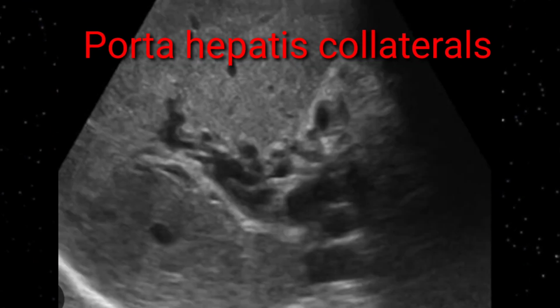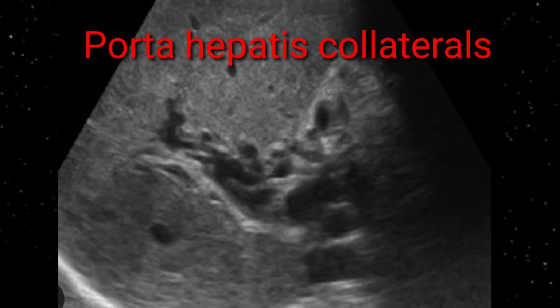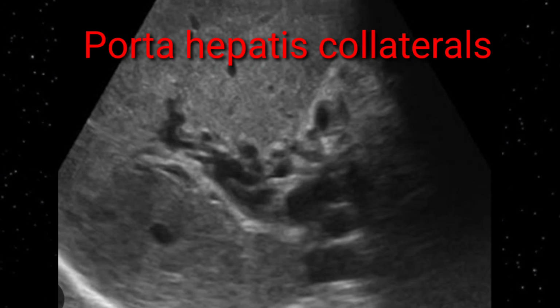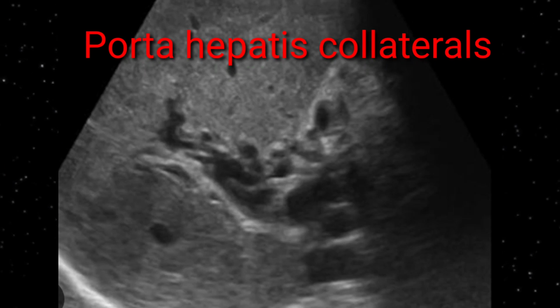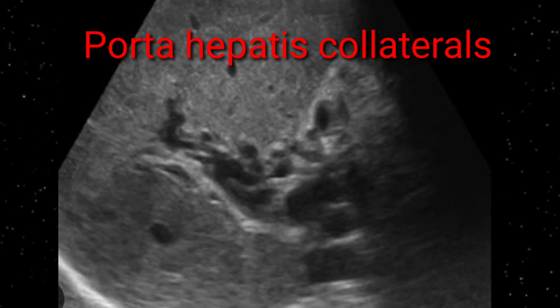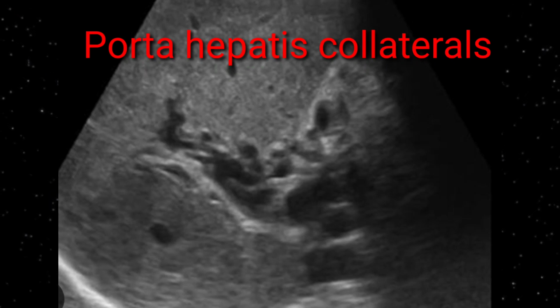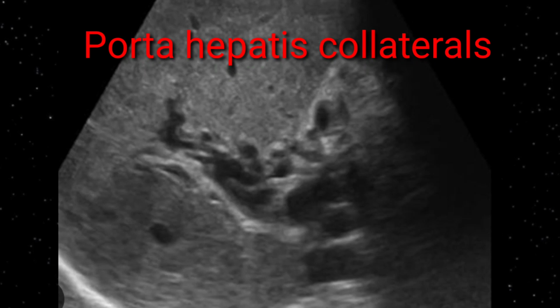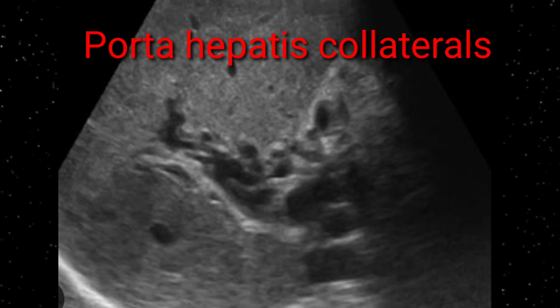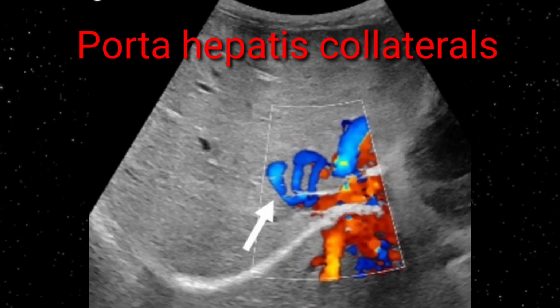On this image, you can see multiple dilated channels at the porta hepatis. This happens when portal hypertension develops in a cirrhotic patient. As a result, there will be multiple collaterals at the porta hepatis. In portal hypertension, you will see an enlarged spleen, dilated splenic vein, and multiple dilated channels at the splenic hilum, or splenic varices. So these are the signs of portal hypertension usually seen in cirrhotic patients.